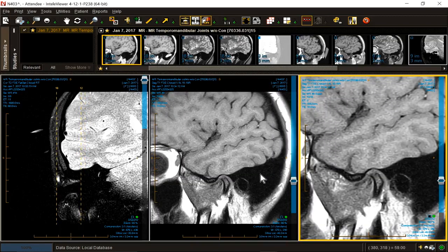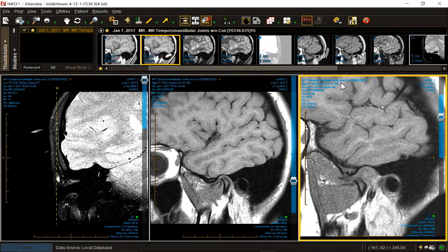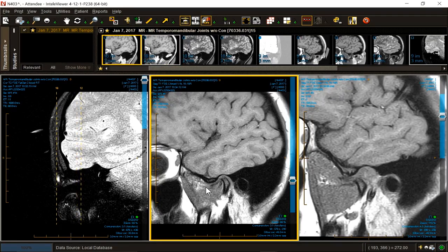Okay. Doesn't look that much dissimilar from the other side, maybe with a few exceptions. These are both closed. Let's see if I can get an open one up. This is open on the right, closed in the middle. Very similar to the opposite side, with maybe one exception. Look at the top of the condyle is eroded. She's only 17 years old.